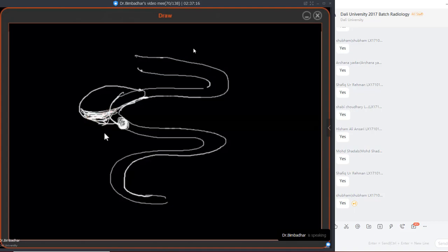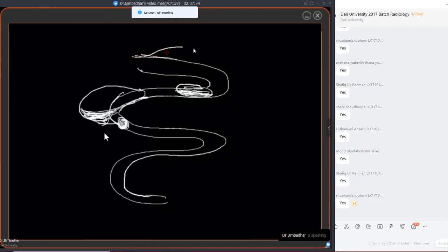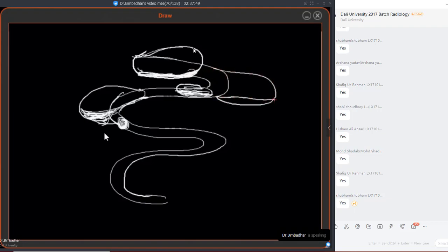Then above it, this one is going to cause a much bigger dilatation, so it is going to cause an air fluid level somewhere around here. And because the air keeps entering from above, this part is close to the mouth, so this one will show more air and a little fluid. And this one also has more air, with a little more fluid compared to the proximal region. And then here this one became abnormally dilated.